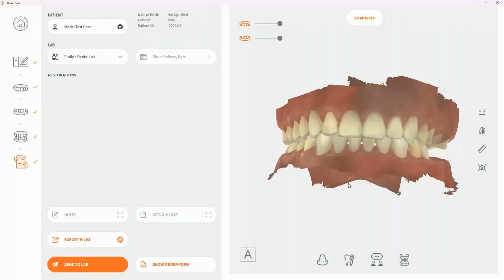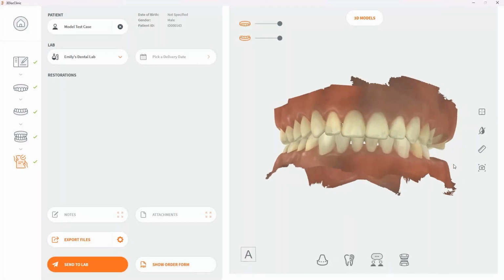All right, now we're going to address the Model Studio tool. You'll see here that we're in the case finalization stage. The case has been processed and is here on the right-hand side. You'll see tools here in the lower bottom right-hand side. We're going to address some of these at this point. We'll start right here with the Model Studio icon.